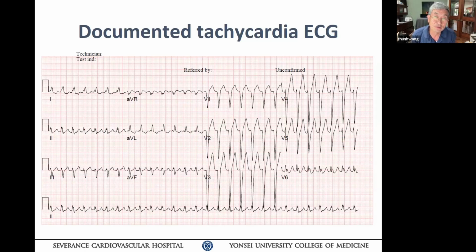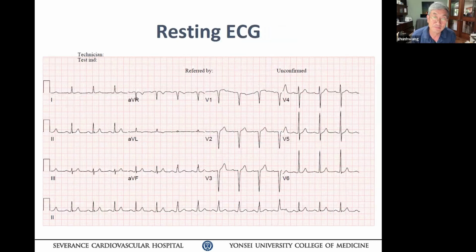It's difficult to tell. It doesn't look pre-excited to me, because look at V1, V2, V3. There's really no delta wave anywhere. How can you call it a delta wave? That's maybe just a 20 millisecond Q wave or R wave. Especially V3, take a look. None of the 12 leads has pre-excitation here. Looks wide to me. Okay, go to the next slide.